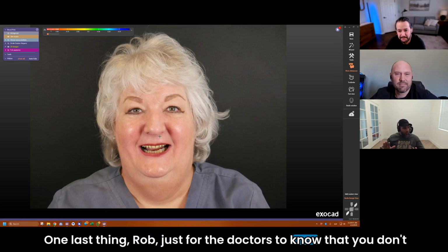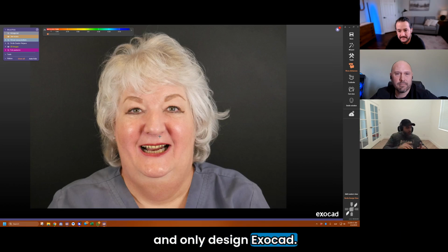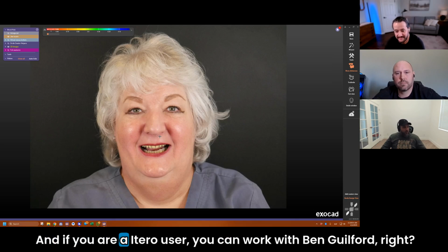One last thing, Rob, just for the doctors to know that you don't have to be in 3Shape and only design in 3Shape or Exocad and only design in Exocad. You can crisscross all you need. That is a good point. If you are a Trios user, you can still work with Daniel Portal. Correct. And if you are an iTero user, you can work with Ben Guilford, right?